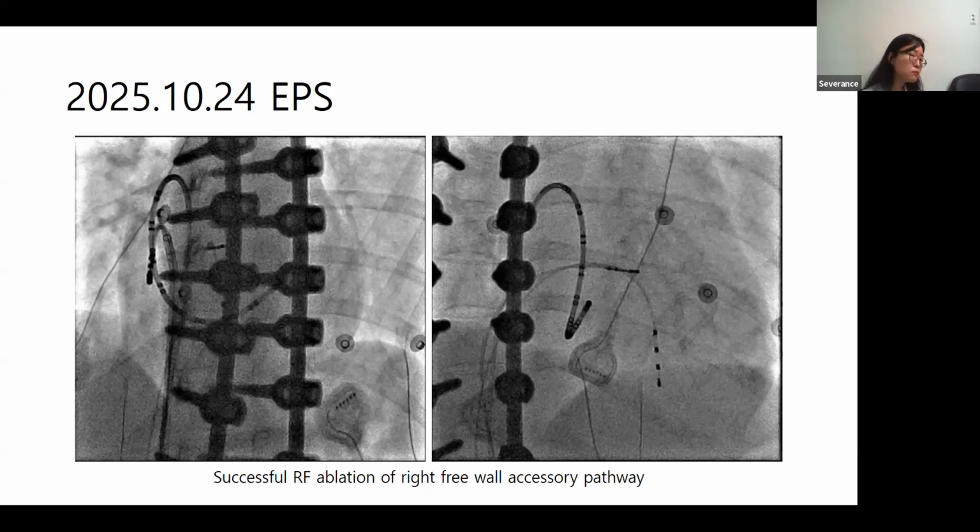If you put the catheter at the annulus like this, it's much better to map because we can use the 3-4, 1-2, or 2-3 electrograms. And I taught Dr. Lee and Dr. Pagma yesterday how to estimate the location of ventricular insertion and atrial insertion based on the electrogram. So after the conference, on Monday, you can see how to differentiate.